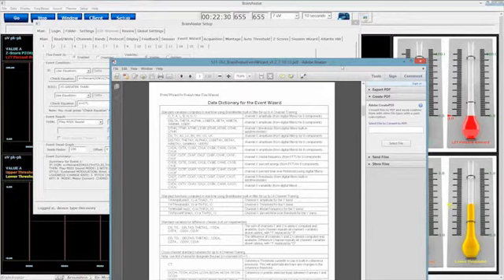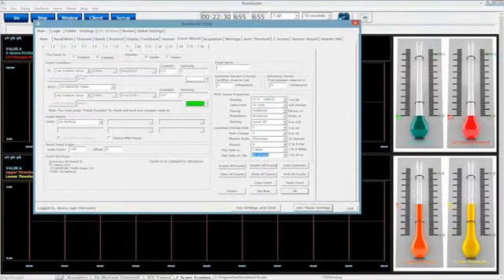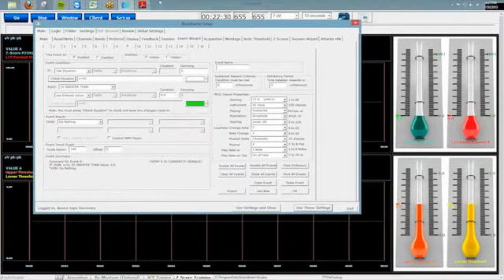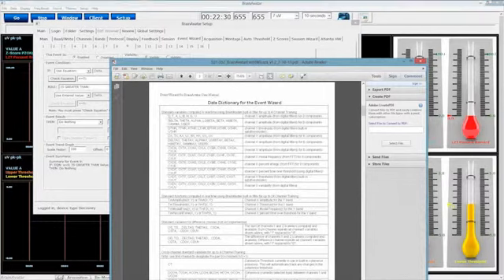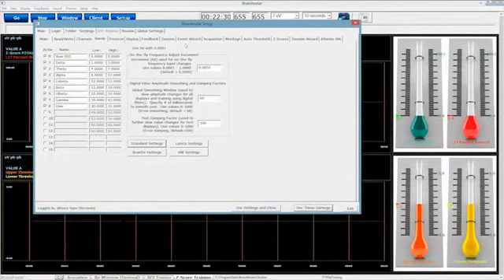Now you have to ask yourself, what's the difference between a variable and a function? Very simple. A variable is just that. It's basically an idea that gets assigned by something else. So I'm going to go into a random later event of this protocol right here and show you. X equals D, as we know from looking here, is basically channel 1 amplitude from digital filters for one of the 8 components. All right? So D equals channel 1 delta, which if we go here, we're going to see right there.